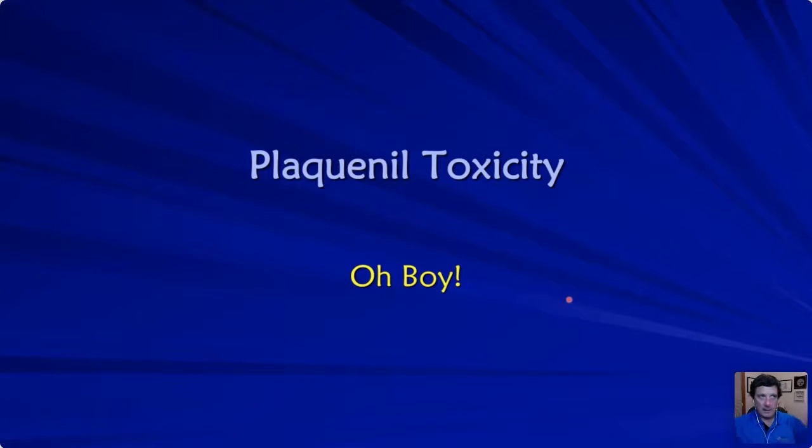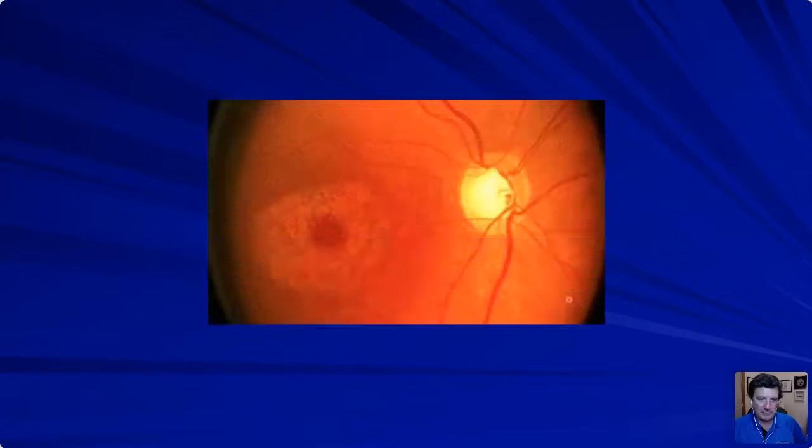And I think it's because we're not sure where to look, which scan to use. Is it a B scan? Is it angiography? I can tell you right now, it's not angiography. This is not a capillary disease. The pigment, the hydroxychloroquine, the Plaquenil builds up in the RPE, and once it reaches toxic levels in the parafoveal areas, the tissue starts becoming atrophied away.